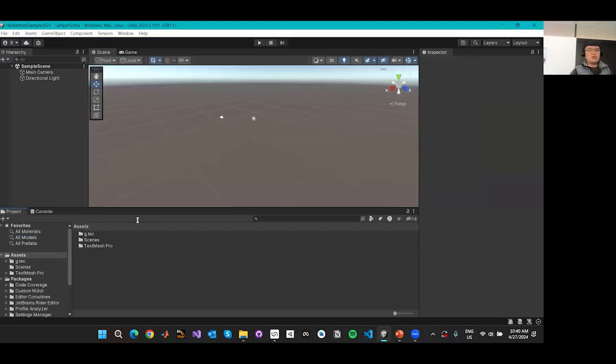Make sure that you check everything that's inside the Unicorn Unity package, and then import the Unity package into this Unity project, and then you will see the assets folder with these few components. And what we're interested in is the g.tec folder.